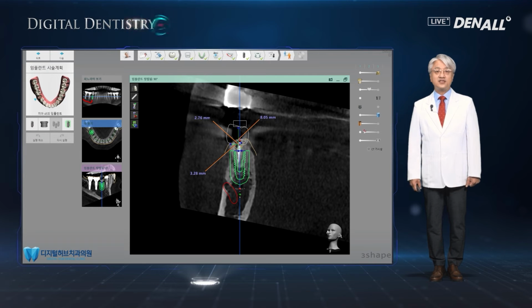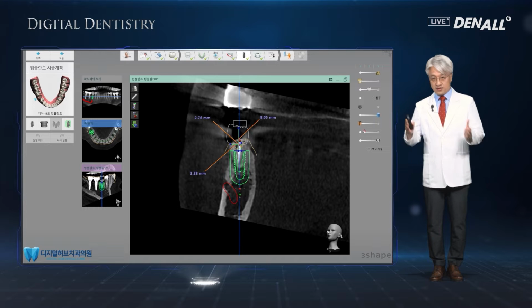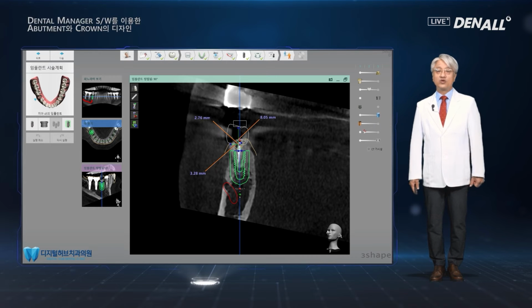Conventionally, before digital implant designing, the process was done by looking at the patient directly. Now on a computer, optimal positioning can be determined according to the plan. On the exact locations, implants can be placed as planned. That is the advantage of using this.